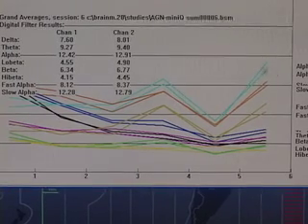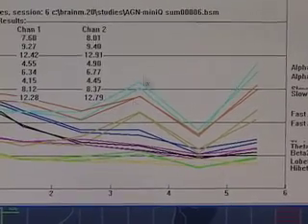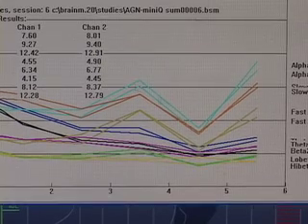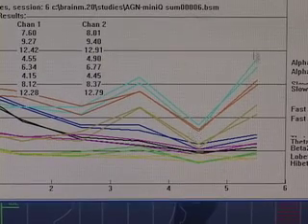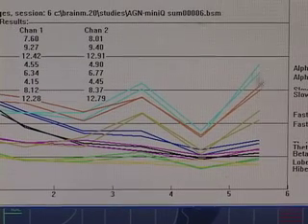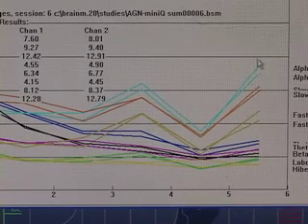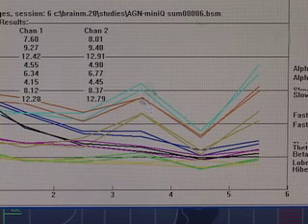I will tell you this is O1, O2. And this peak is P3, P4. And this dip is T3, T4. Do we notice that the alpha amplitudes at O1, O2 are always higher in the normative database? They're higher at O1 and O2, and they're almost as high at P3, P4.